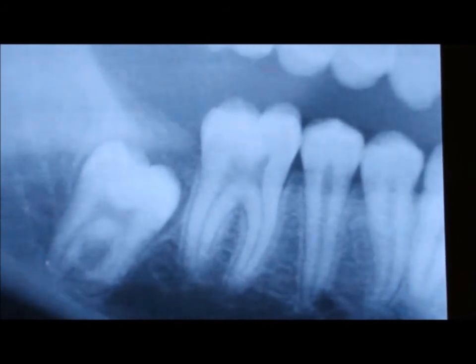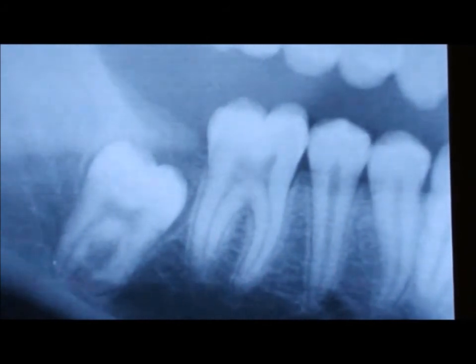I had an impacted tooth here. It's a second molar which was impacted, and I needed to take a decision. Should I remove it? Is there a risk with the inferior alveolar nerve? The OPG is not enough to take this kind of decision. I went through a CT scan, drawing the panoramic curve, looking at the nerve, and drawing the nerve.